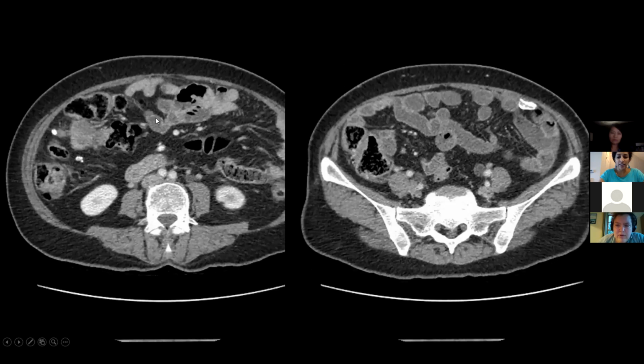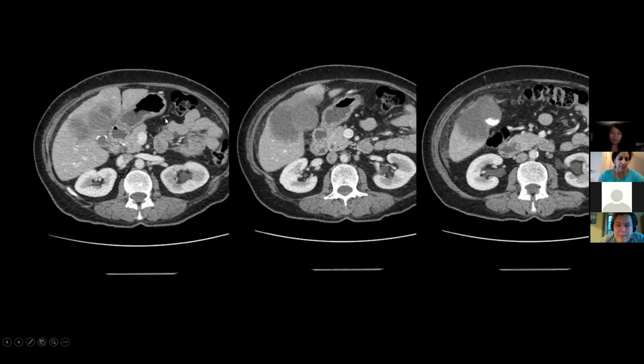And then why do you say there's no enhancing component? I see, for example, that top left image to me looks like a hypo-enhancing mass. This? Yeah. So this is the liver adjacent to that. I will show a few more images to you later, also MR of this. Yes, you're right. We shouldn't be really talking about lack of enhancement, or true enhancement, unless we have a non-contrast and then compare to the enhancement.